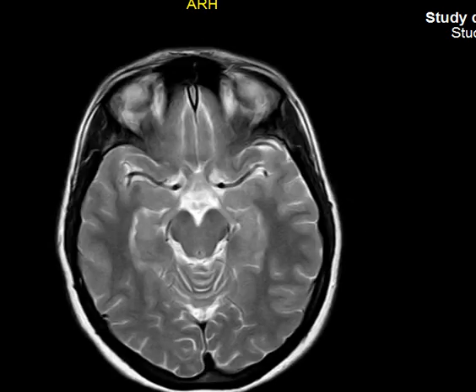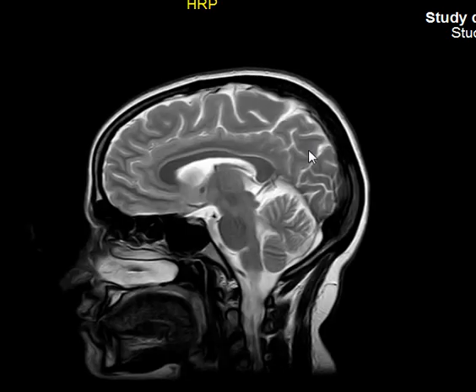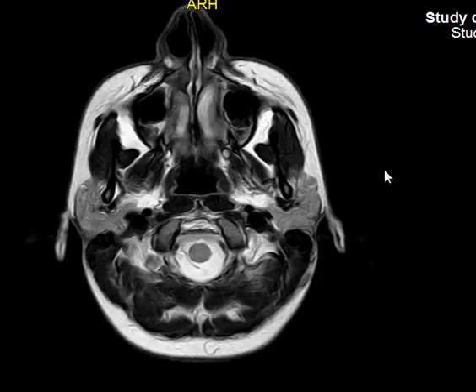And the third one is what? Sagittal. That is perpendicular to the coronal, like this one here. These are sagittal images. This is the first thing. So we are agreeing that the planes are either axial, coronal, or sagittal. There are other planes like axial oblique, coronal oblique. We will not talk about them now. We'll be satisfied with the basic ones. First, we'll start with the axial. The axial images are the most basic one. You need always to start with the axial and you work your way from that.